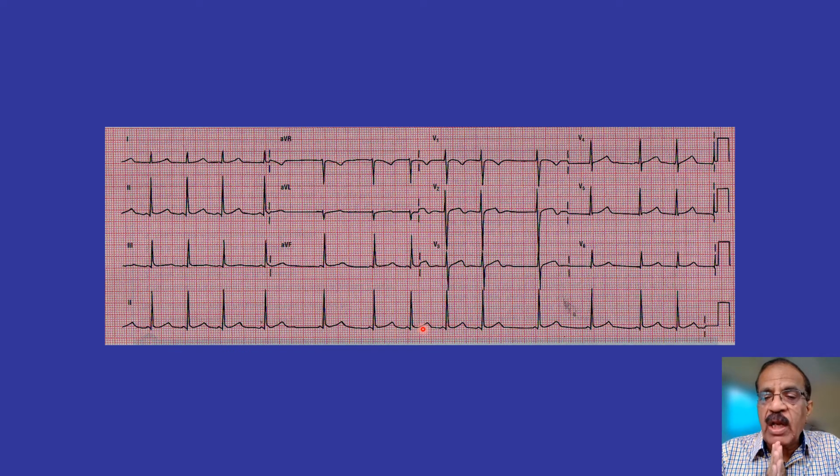RR is not regular, but you remember in some cases, some variation in RR is possible despite having normal sinus rhythm. Now, if you see again, there is a kind of pattern, this wave-like pattern. This symbolizes that heart rate accelerates, decelerates, accelerates, decelerates, and accelerates. So there is a kind of pattern in this arrhythmia also.